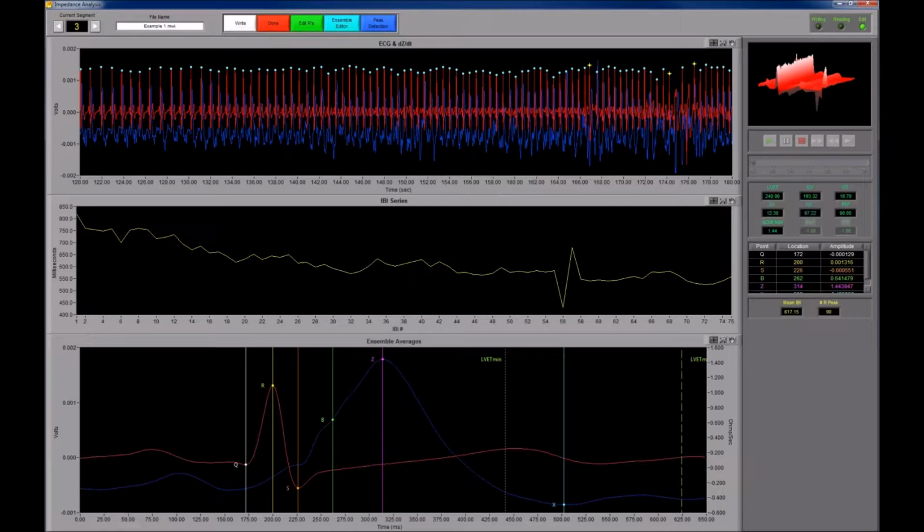It could be because DZDT is still trailing off at the end of your window, so it could potentially be occurring outside of the range in which you're looking. Or it could just be that there wasn't an obvious trough in that section. Maybe it occurred before that LVET window. And you can always use that Ensemble editor to go in and adjust it if you can see the X point and the algorithm simply wasn't able to identify it.